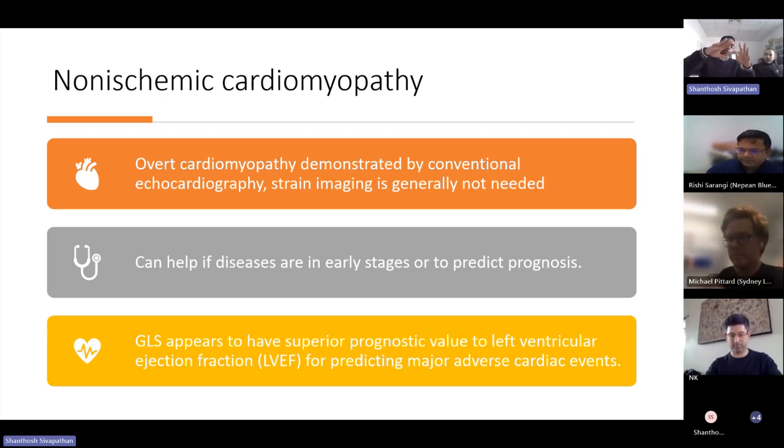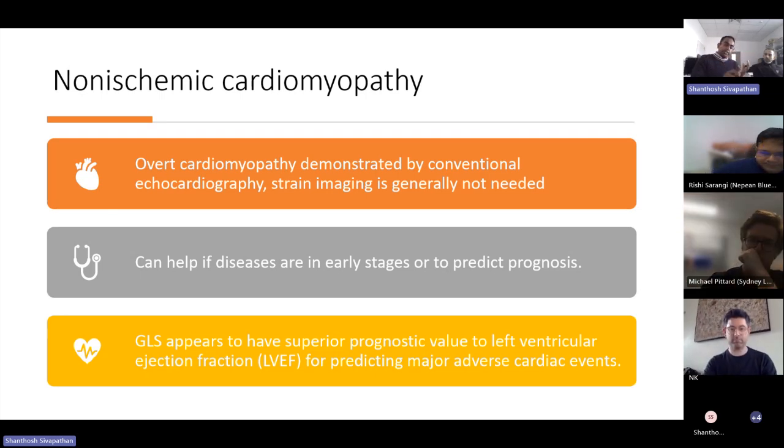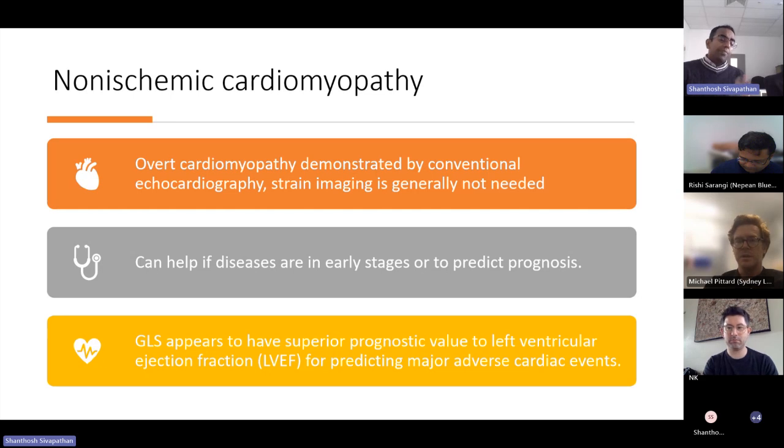And that's why when you get that strain measurement, I look at, well, are the curves all aligned? That will tell me whether it's tracking. Or is the overall plot, the bullseye plot, uniform? And if not, then I'll be looking at the tracking and going back and doing a reassessment. So that's important. But then again, there's also going to be some variability between myself and yourself.